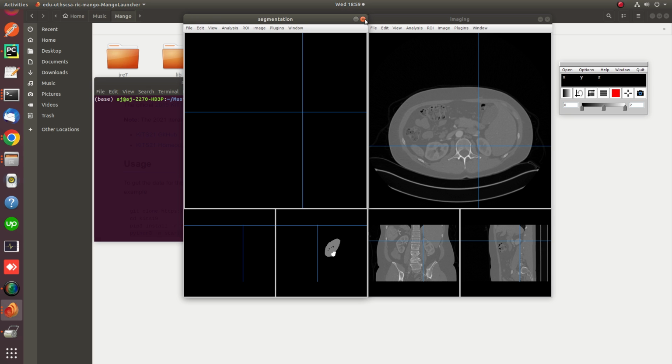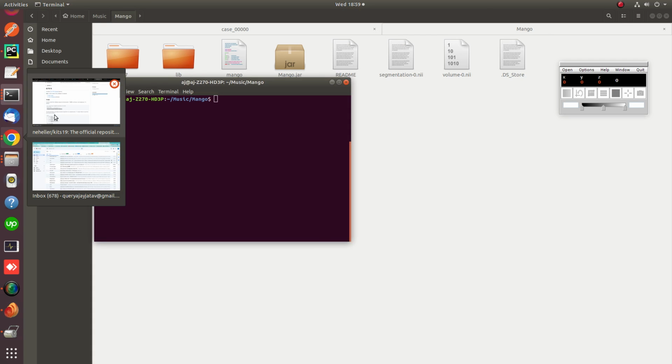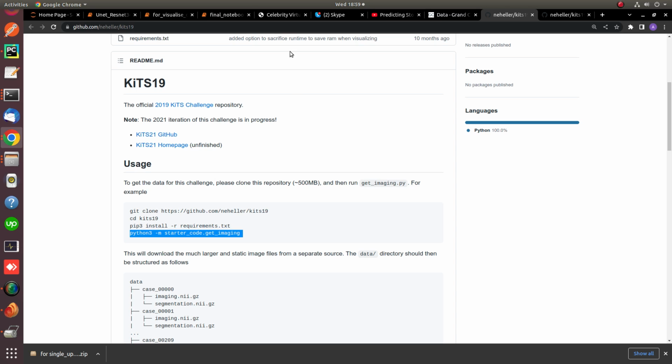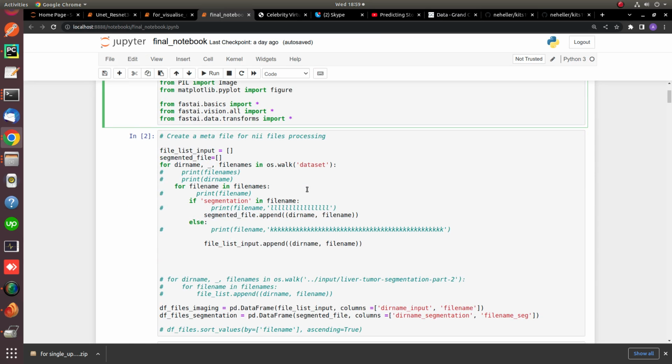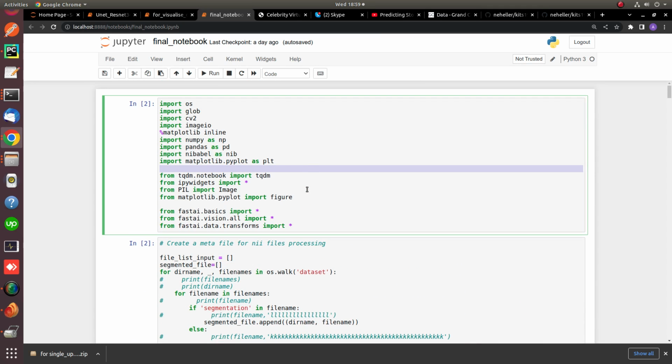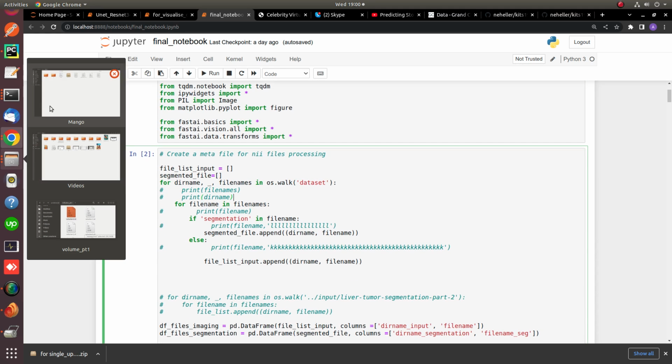Okay, this dataset is available in 3D format, but due to the inconsistency in the number of layers in the dataset, you first need to create an algorithm which converts the 3D dataset into 2D format, and thereafter perform the segmentation, and later on reconstruct the 3D images from the 2D segmented parts. Okay, so let me give you the overview of the dataset.